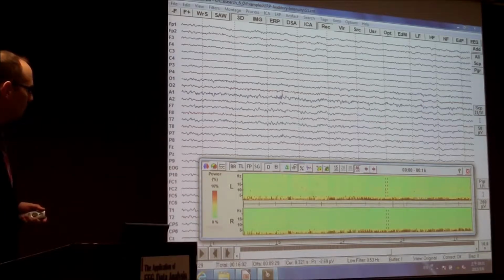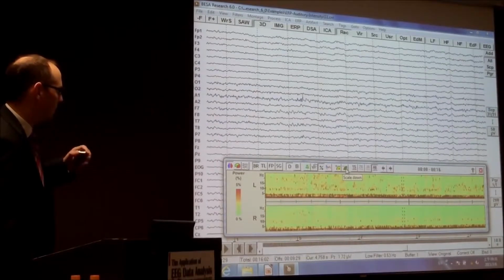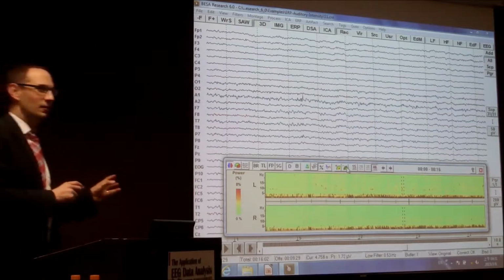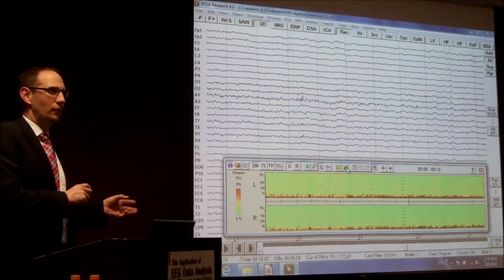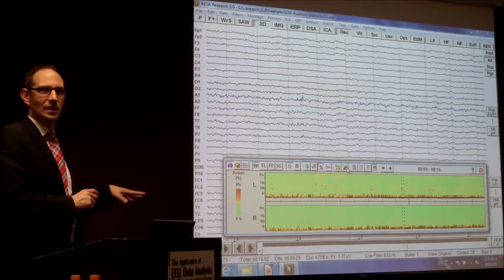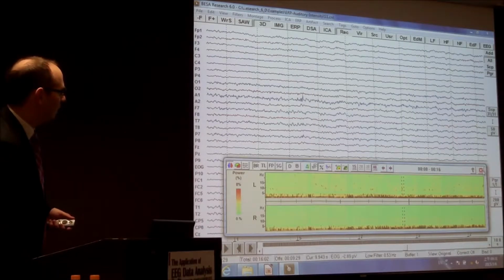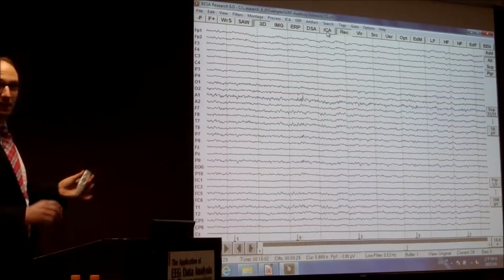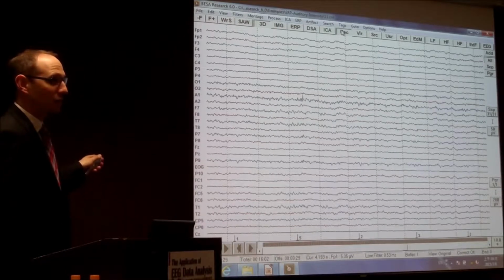And certainly you can increase the scale down, scale up, and so on. There are a lot of other buttons. I will not explain right now because I perfectly want to recommend to work through the big tutorial we have on our webpage, because then everything will be explained. If I go to every button and every functionality, then we will need this 3 days I was talking before. Okay. Then we have an ICA here, so we can calculate an ICA. We come to that later as well, because we want to do that, and I want to show you artifact correction together with ICA.